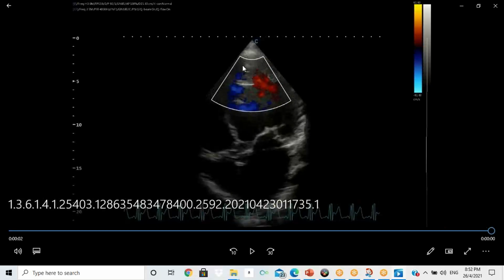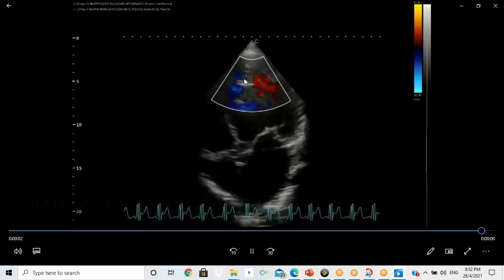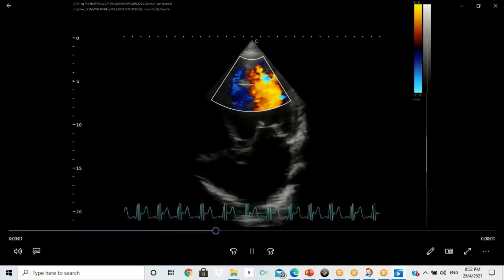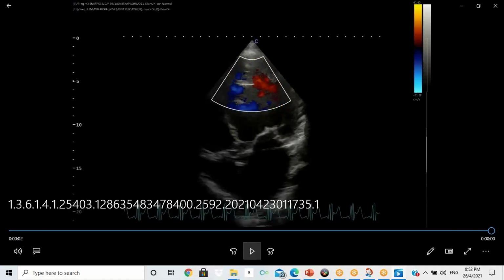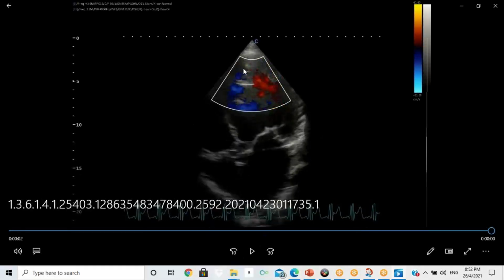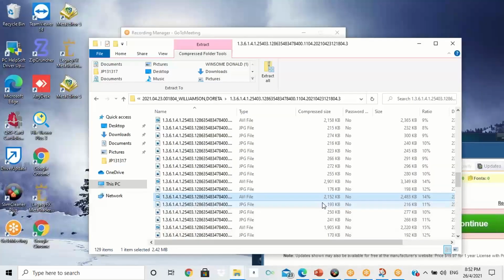If the color fills all the space, then there's no space occupying lesion. If the color did not fill all the space, then there could be a space occupying lesion. We use contrast, and we'll go over all of that, but contrast is a much better tool to look for a mass or a blood clot in the apex.